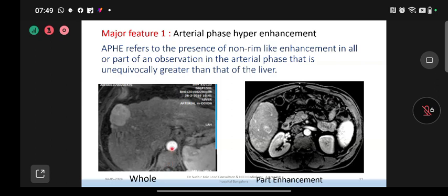You will find two structures. One is rounded, and the other is generally oval shaped, to the right. The one usually on the left is the aorta, well defined and rounded. If this is hyperenhancing and the adjacent structure, the vein, is not enhancing, then you know that you are dealing with an arterial phase.